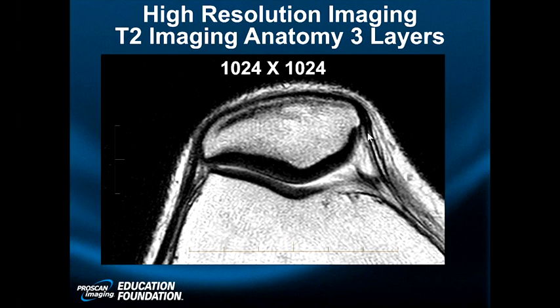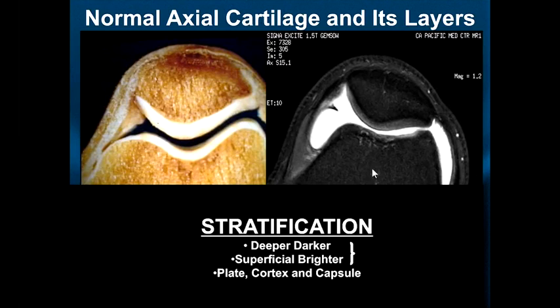And then we've got the medial patellofemoral ligament and the lateral retinaculum and the medial retinaculum and some more superficial components of the medial retinaculum. But yes, the MPFL is seen as a distinct structure. So here's some stratification.